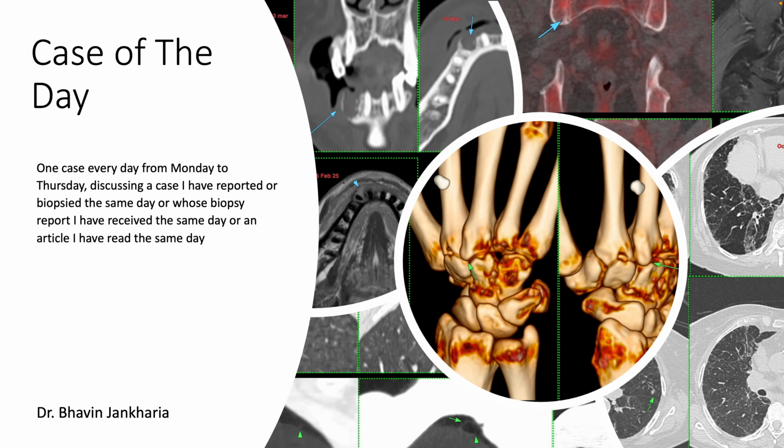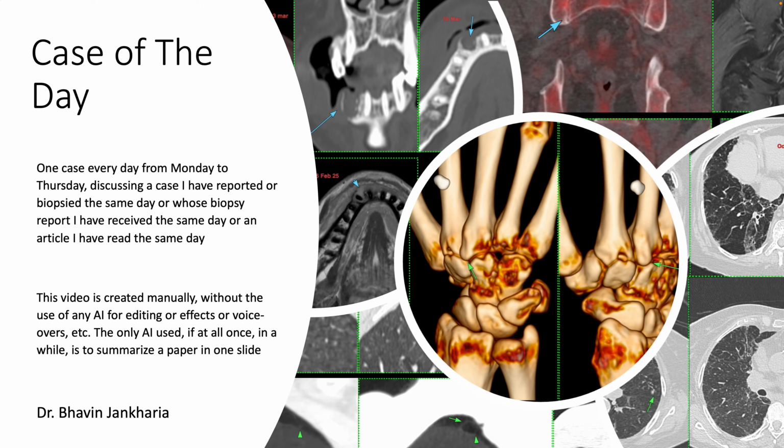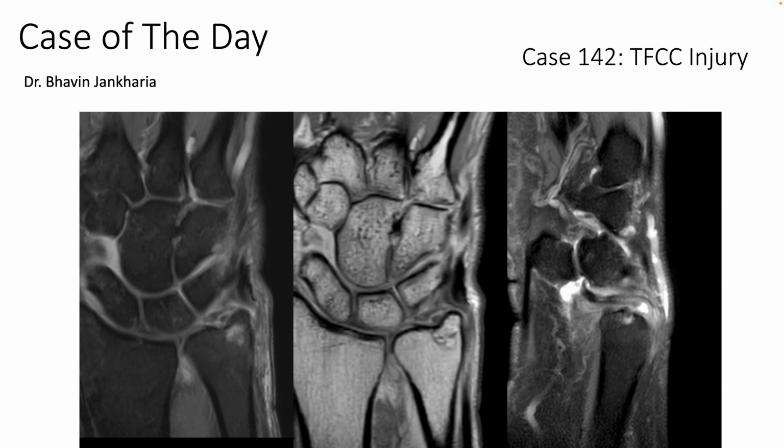This is case of the day, one case every day from Monday to Thursday, and completely created manually with no AI. Today is the 142nd case of a TFCC injury, or the triangular fibrocartilage complex.